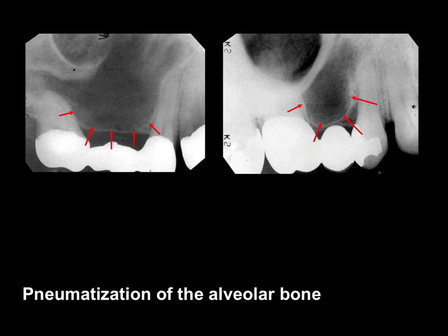You have there an isolated upper molar. If you were to extract that tooth at some point in the future, obviously you would first have to separate it from the bridge, but if you then extracted it, you would have an increased risk of exposure of the maxillary sinus and the creation of a communication, or possibly of fracture of the maxillary tuberosity.